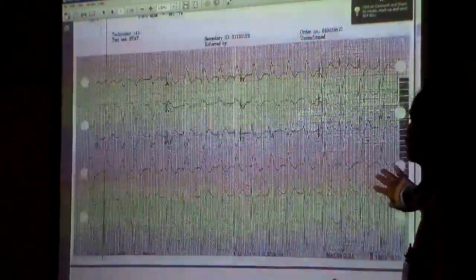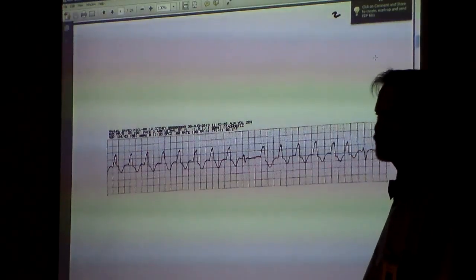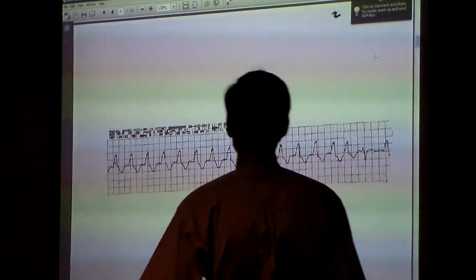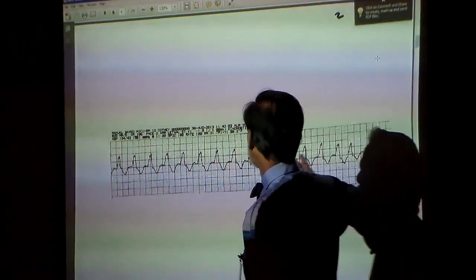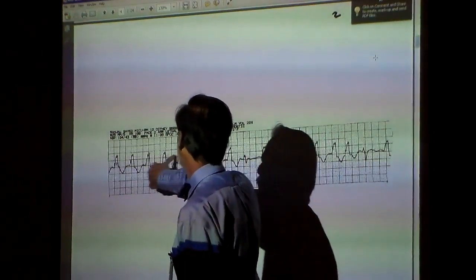So I think this was a patient we talked about, an ICU. Mr. Gordon. So what I did, I said, let's just watch for a minute on the monitor. And so we watched for a minute and then I saved this thing. And so tell me kind of what that tells you about the rhythm. No, this is dead regular, okay?